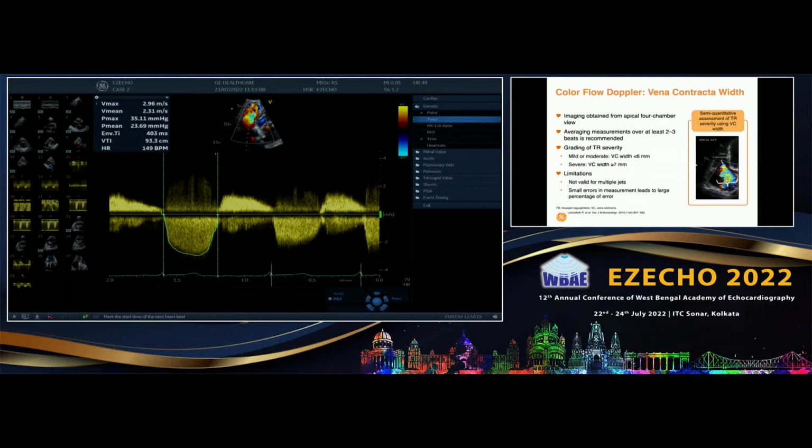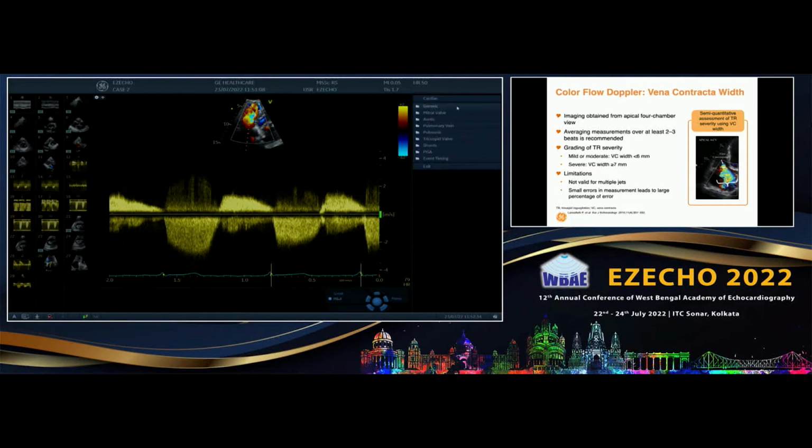Nitin, is it because of only tricuspid annulus enlargement or there is an RV dysfunction also? That is a very important thing. I think here even the tricuspid has got a rheumatic affection. So there is a primary pathology there. That is why I said that before putting a color Doppler, always look at the leaflet more carefully. You can trace the tricuspid, how much is the gradient across the tricuspid valve. You can assess forward flow also.